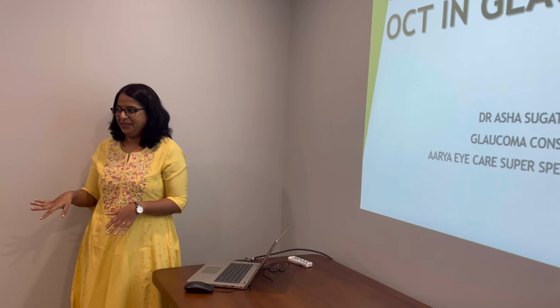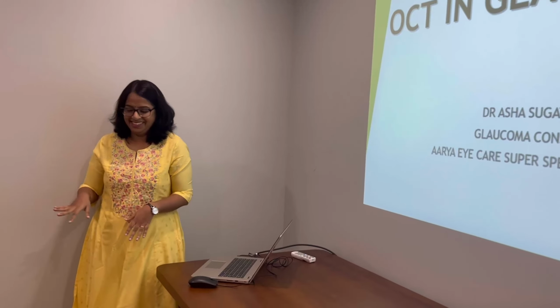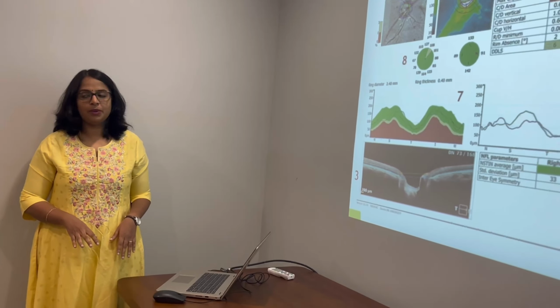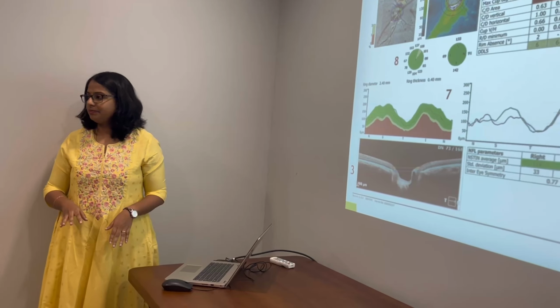Interpretation of the OCT. We will not be going into the theory. So this is a report of an OCT of the optic nerve head. We can divide it into 8 sections, and if we go in an orderly manner, it will be good to analyze.